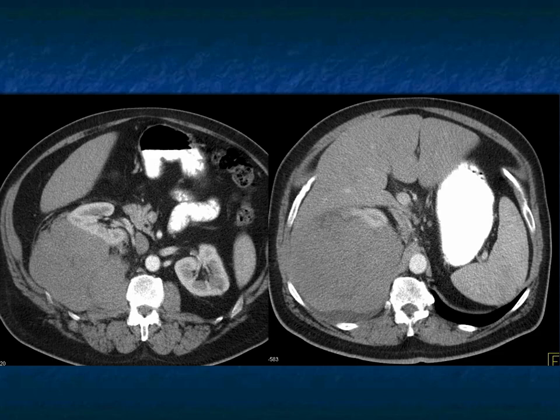We talk about tumors that arise in the space, perhaps a tumor arising off the capsule of the kidney. That's a thought, but it would look different. The kidney here is compressed and displaced, and the psoas muscle is involved. So what else occurs in this region? Okay, think about it for a second.